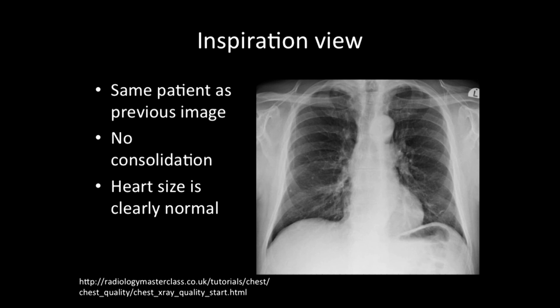This is the very same patient, except this time it's an inspiration view, and you can see, what do you think of that left base now? You can clearly see that the left hemidiaphragm is seen all the way to the vertebral margin, and you can see that there's no consolidation at the left base. And you can also see now that the heart is of normal size, so it's less than 50% of the transverse width of the chest.